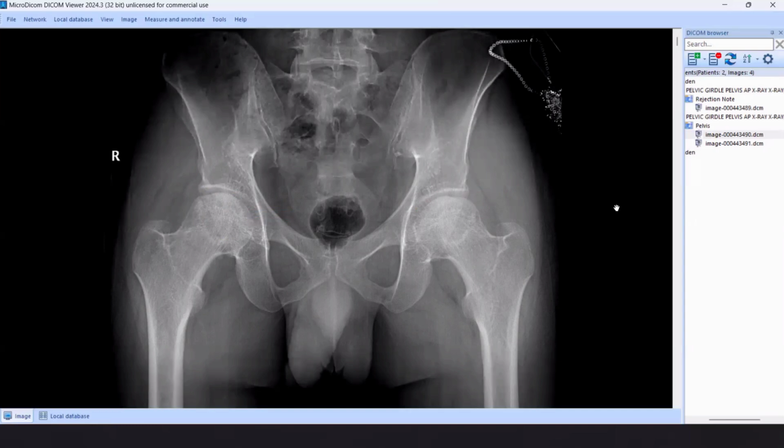We have different grades for avascular necrosis. First grade, minor osteopenia. Second grade, geographic areas of mixed sclerosis and lucency. The third grade is like the second grade, but we add subchondral fissure, and also some flattening or irregularity of the femoral head. I think we are between grade 2 and grade 3, and more likely toward grade 3.